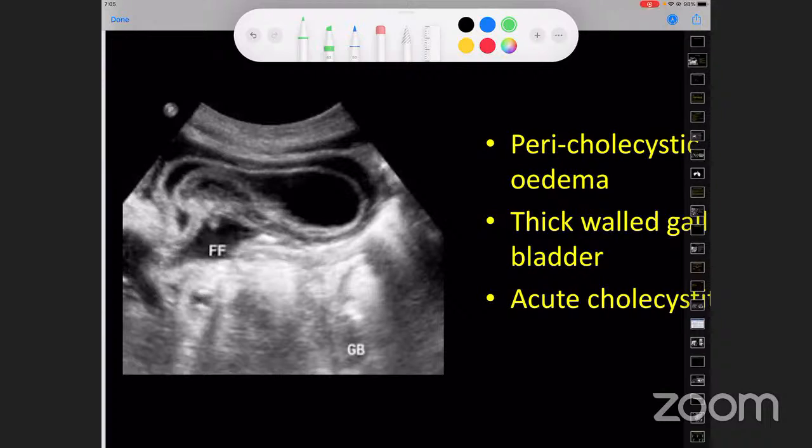First of all, I could see this is a gallbladder, which has uniform wall thickening and wall edema. Significant wall edema is there, although the lumen is anechoic. A small amount of sludge I could see probably in the body region, and there is a small pericholecystic fluid collection.